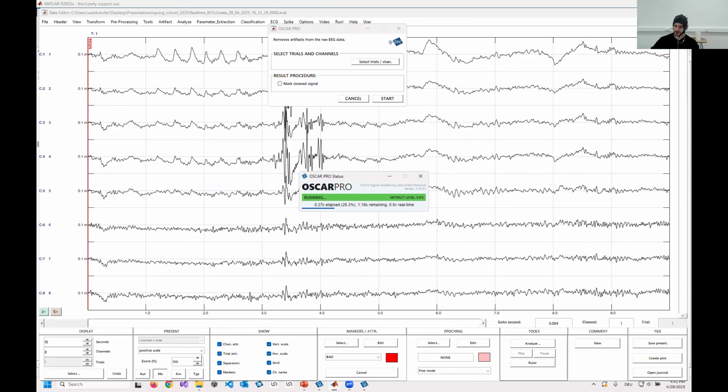And after I've shown you how to process data offline, I'd also like to show you how to acquire data with g.Recorder and process it in real time in g.tec with a paradigm running in g.tec. That's something that might be interesting for research use cases where you're in a clinical environment and having g.Recorder recording data, but in parallel, you want to test some signal processing or some research experiment, then you can use this kind of setup.